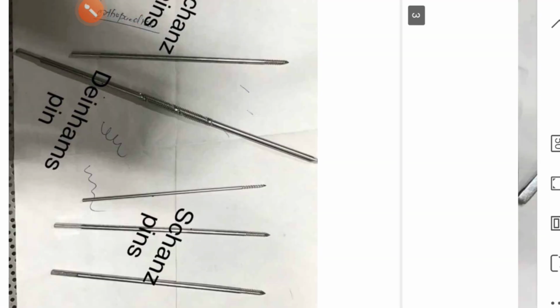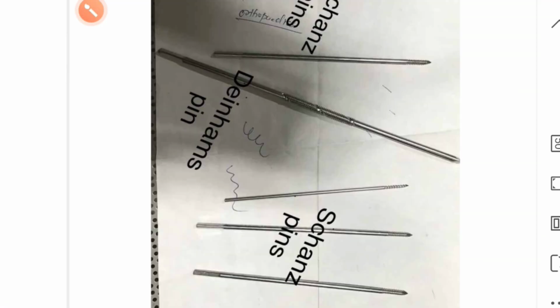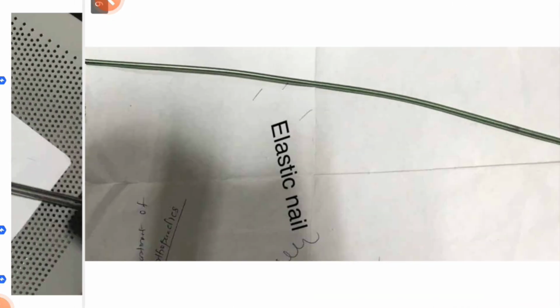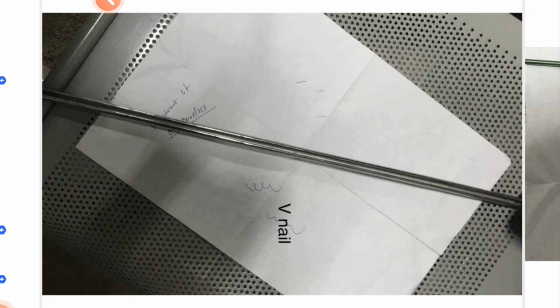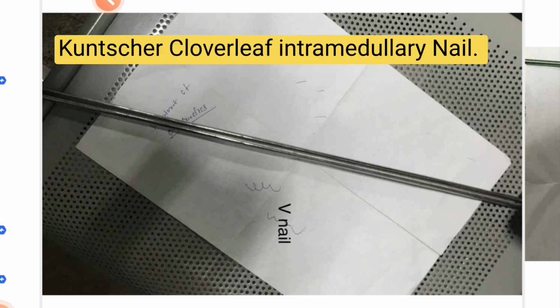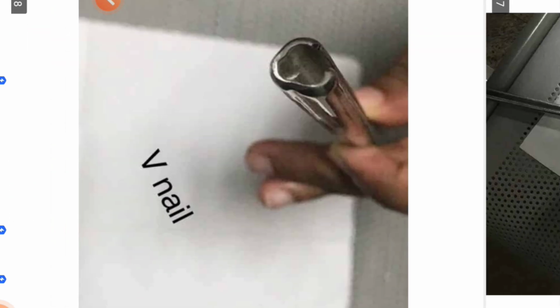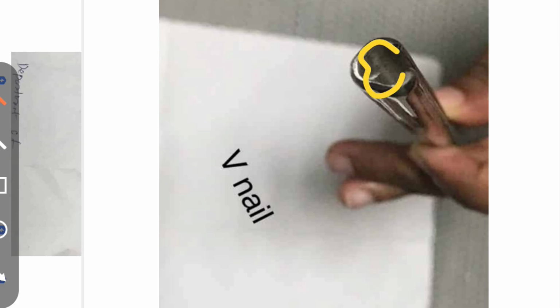Next you can see there are three things: Denham pin, Schanz pin, and another one like a Steinmann pin. In the Denham pin, you can see there are threads at the center. The Schanz pin is sharp at one end and blunt at the other end. This is the Rush nail. This is the elastic nail. It is made of titanium. Next is a V nail. It is like a V in shape. Now it is obsolete and not used.